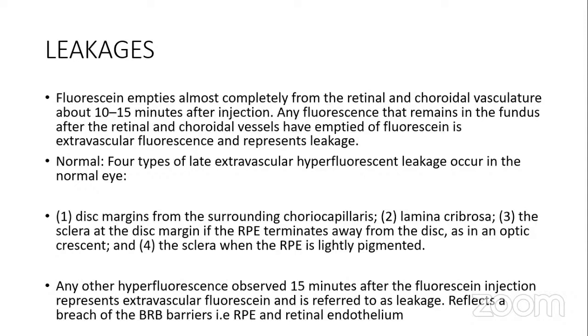Okay, and most times you want to check after the dye is meant to be absent in the retina. So 10 to 15 minutes after injection of dye. So what you see is what you characterize. However, in some parts of the retina, some form of late extravascular hyperfluorescence is normal.